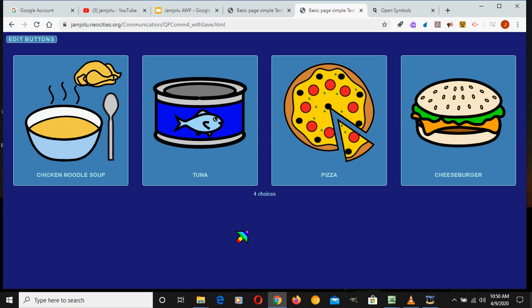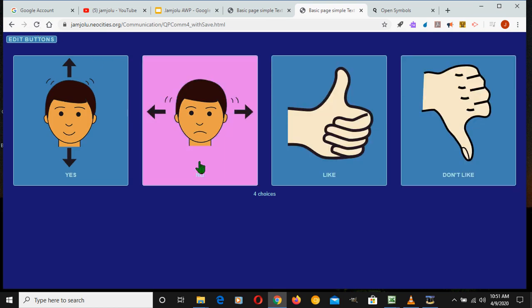Okay. So the next time I reload the page, that's the voice we should hear. Let's just test the voice on this page. I really want pizza. Okay. Let's reload the page. Okay, so as you can see, the page reloaded and the voice remained the one we wanted. You can save all the changes that you make to the page, the look and the voice, by pressing Alt, Shift, and S.